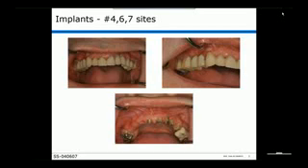You then remove the tray, pour the stone model. Do not remove the model from the tray. You now scan the tray in your scanner. So as you can see, that merge will be absolutely perfect, where the gutta-percha points are entirely in a different plane than any scatter you could possibly have. So you get dead-on merges every time with that system.